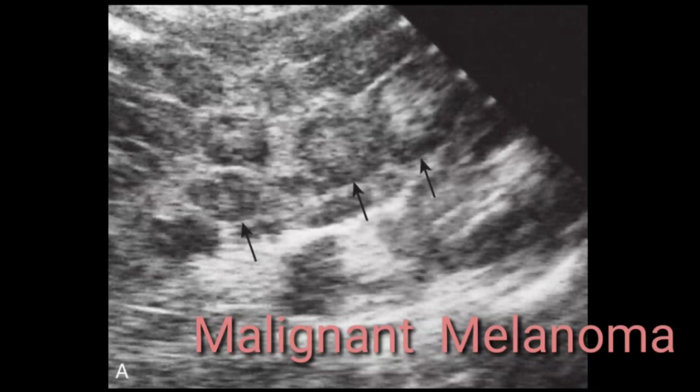Have a look. This slide shows metastatic deposits from malignant melanoma. Here on this image you can appreciate multiple target lesions. These black arrows indicate target lesions, or you can also use the words bull's eye sign. Centrally these lesions become hyperechoic and are surrounded by a hypoechoic halo.